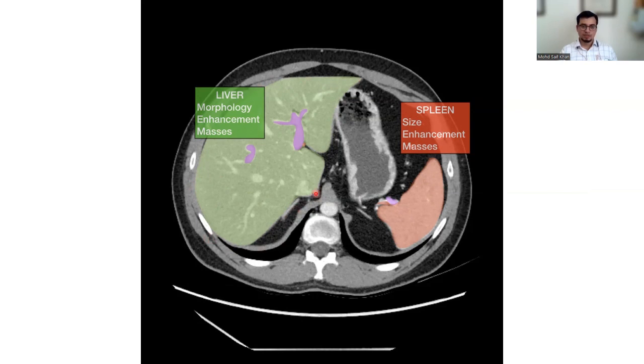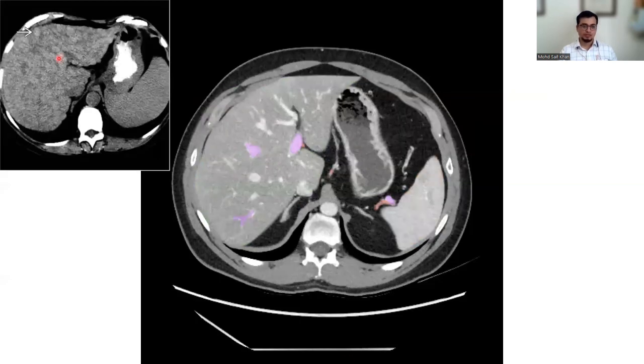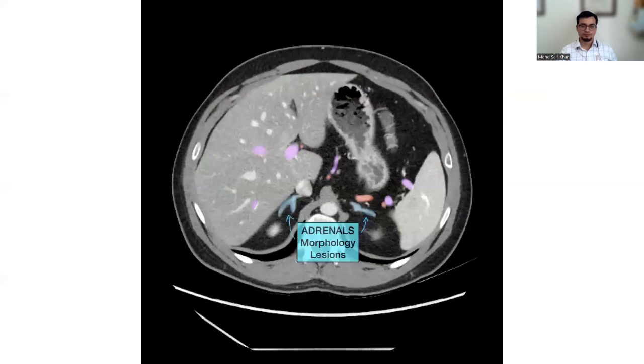Can you appreciate? Sometimes this smoothness is gone when the liver is infiltrated by various disorders, especially in cancers. This congruity or smoothness of the liver border is gone. It becomes rough, and nodules will be seen. Here you can see a cirrhotic liver, with so many small hyperdense regenerative nodules.